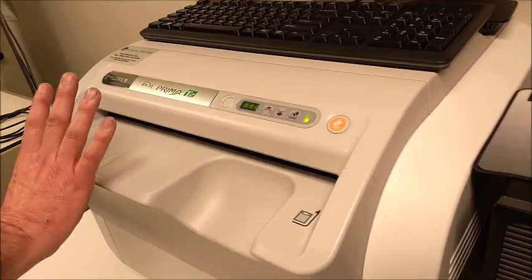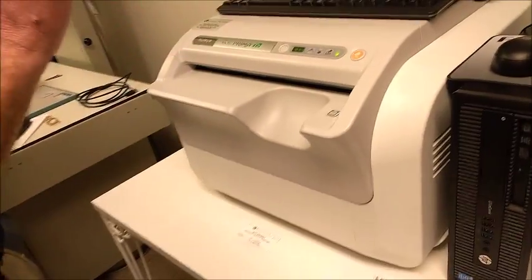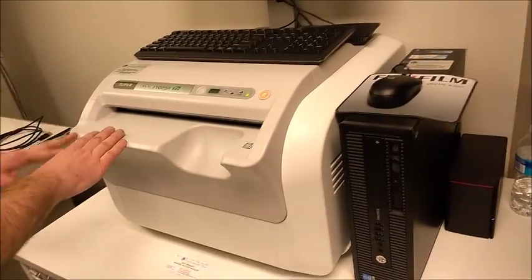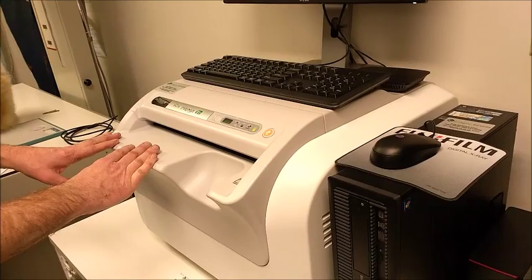And don't worry if you forgot to turn that on and you try to put the plate in, it won't work. If you put the plate in backwards, upside down, it won't work. It's always going to beep beep beep beep, but it's not going to break it. It's not going to let you damage anything in there. It's foolproof in that respect.